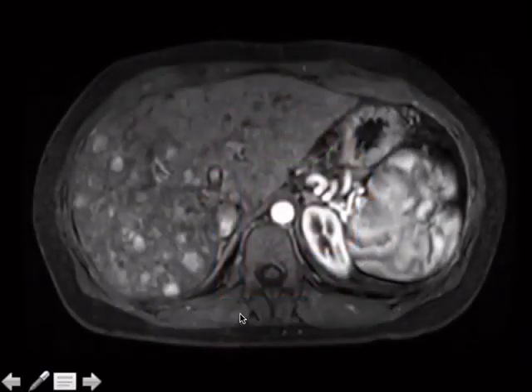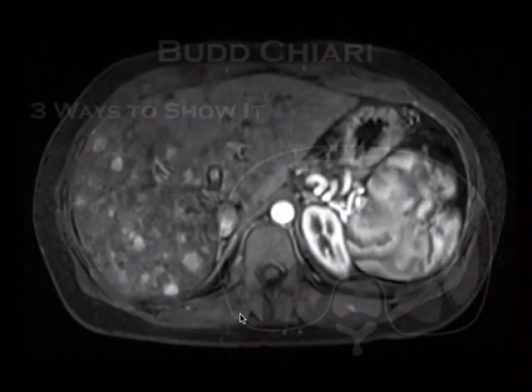Okay, moving on. I love this case. It's an MR case, a contrasted case. You can see the contrast in the aorta, and you've got a whole bunch of enhancing things in the liver. The liver otherwise doesn't really look cirrhotic, and that's a bunch of HCCs or METs or something. You're like, okay, this guy doesn't have a history of METs. But I'll tell you that you can't see his hepatic veins. Well, scroll up and down, and we'll tell you he doesn't have hepatic veins. They're out. So this is your Budd-Chiari case.